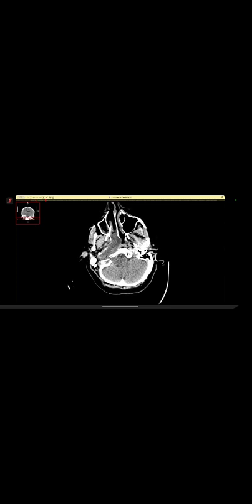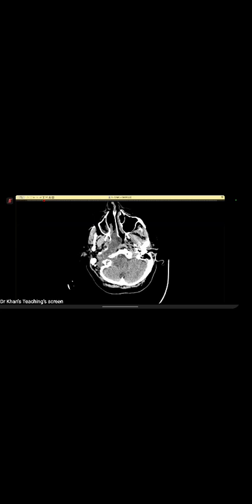Now, a portion of it goes into the carotid canal and then posteriorly, while there is a tongue of mass which goes anteriorly. Now, if you see carefully, this is the sphenoid, sorry, the adenoids, and there is a tongue there which goes into the nasopharynx, and then it goes inferiorly.